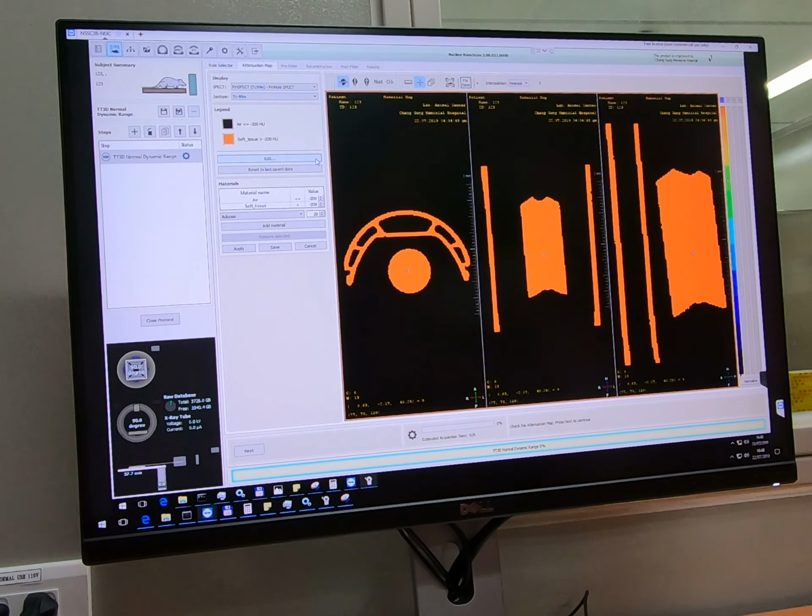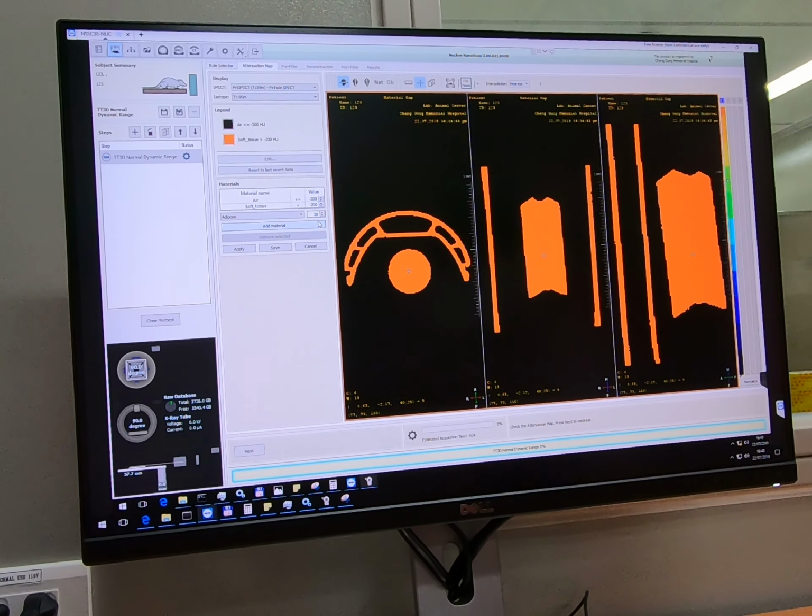I don't really use this frequently, but there are different types of tissues, and you can set up different kinds of thresholds which the system will use. It's much more sophisticated in the case of PET/CT systems, because there is a range you can set up. Here it's only one threshold. So I don't really think it is useful.